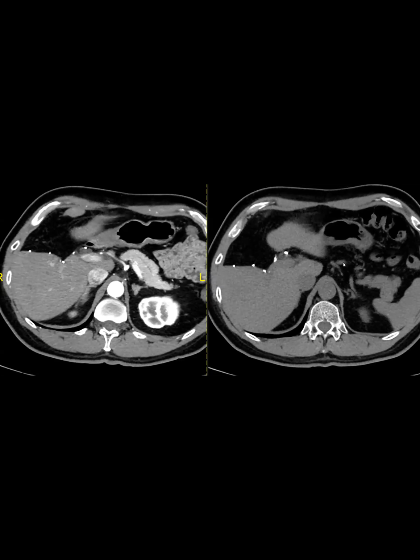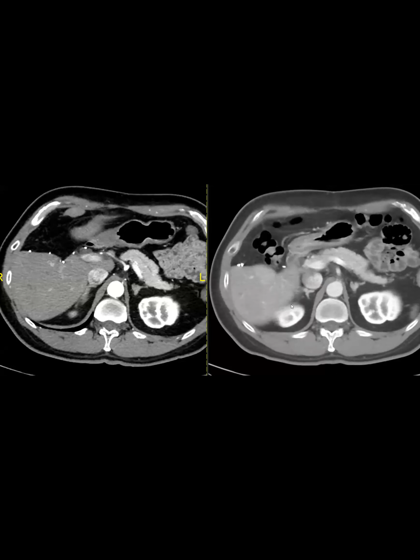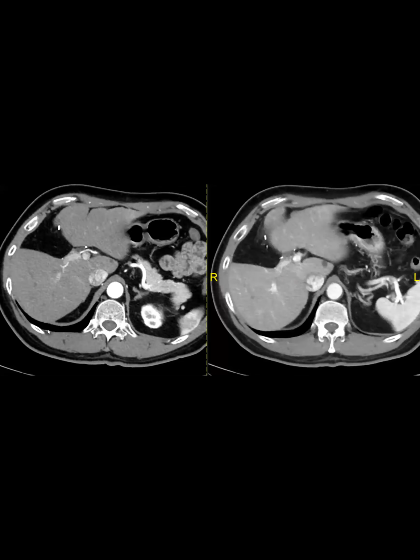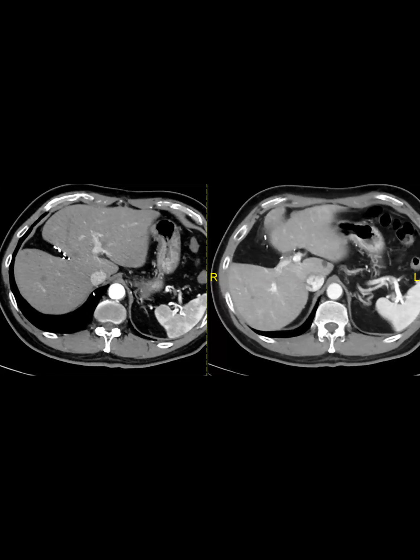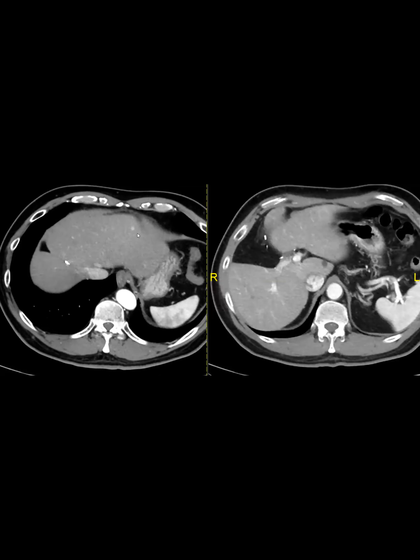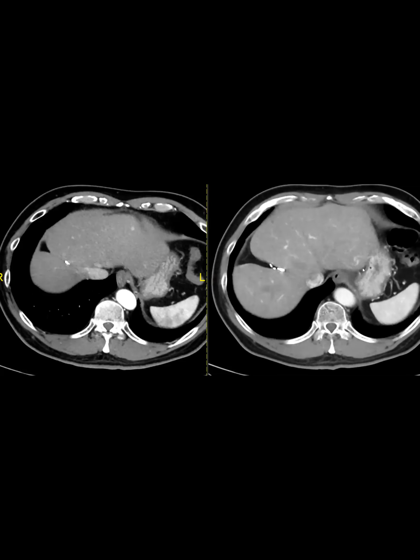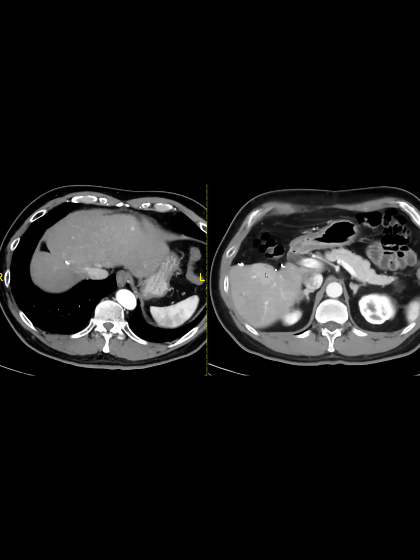No steatosis. The patient had Hep B. You can see the patient had some prior patchy foci here and there that they said were probably perfusional, like this one, and it kind of still has that. So it has a very geographic area.